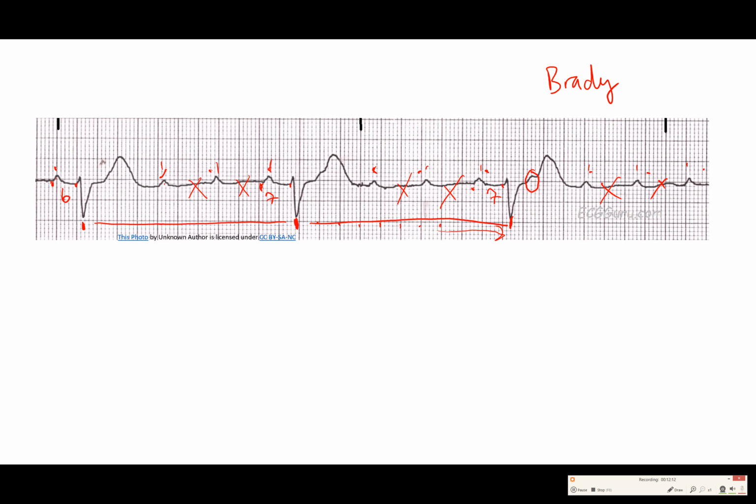You see that extra bump inside just before we get to the T wave or just at the beginning of the T wave. And if you marched it out and you looked there, P, P, P, look at that. It marches right along. So there's actually a P wave hiding in there. And you might imagine there's a P wave right in there, which would march right along with the other P waves.